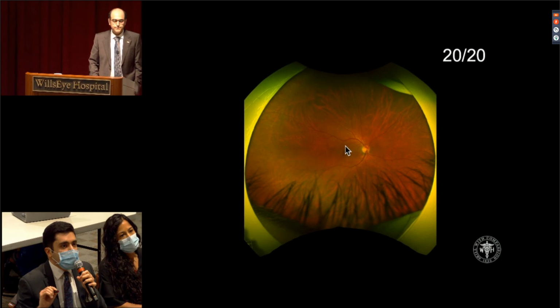Just looking at the retinal pigmentation itself, there is this subtle hypopigmentation perivascularly just along the superior arcade. Hard to tell if that's actually real versus just the appearance of the nerve fiber layer on the pseudocolor, and the retinal periphery appears grossly intact here.